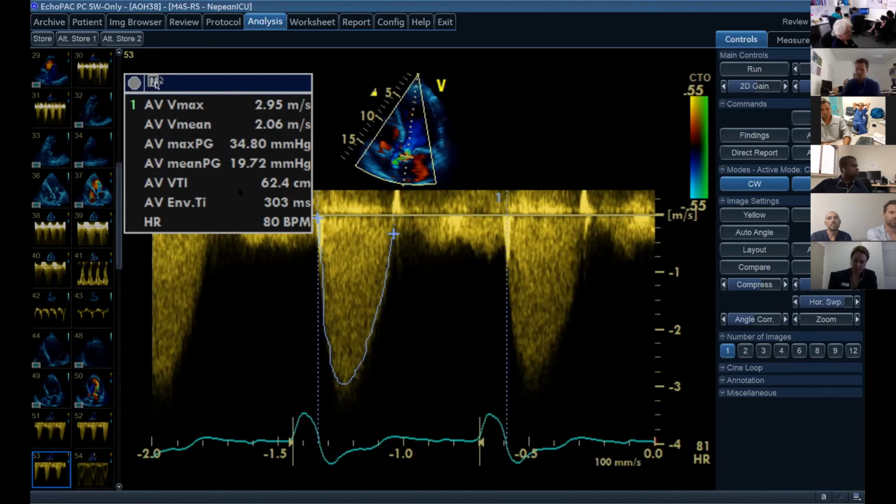All right? So that's the first error that we've got to be careful of. So once you've got the LVOT diameter, or area, excuse me, you then times that by the LVOT VTI. So we then times that by 26.6. And that is going to be equal to the aortic valve area times by the VTI, as long as there's no LVOT subvalvular or left ventricle obstruction or obstruction in the ascending aorta. Yeah?